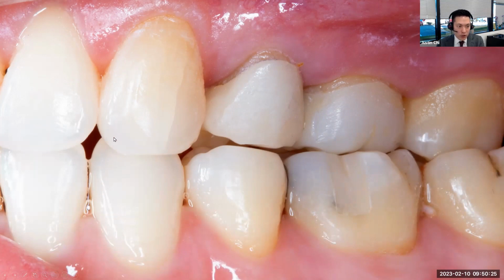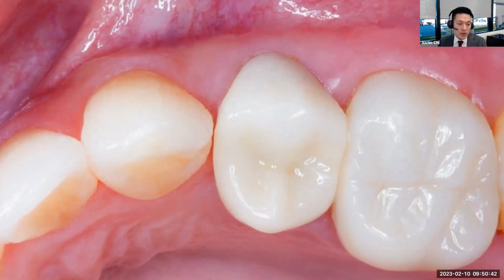And then she's in normal occlusion, where the uppers are beyond the lowers, on number 11 forward. So on this premolar, if we can try to establish a good buccal cusp overlap, we're going to try to do that. Not only is there a gap at the buccal cusp, but there's also a gap on the mesial contact there. So we can certainly close that with our design.